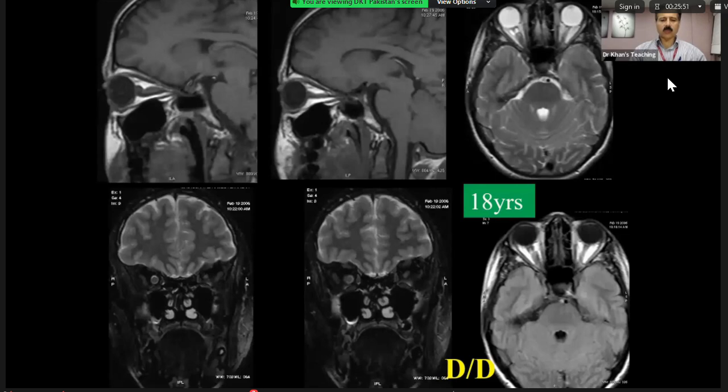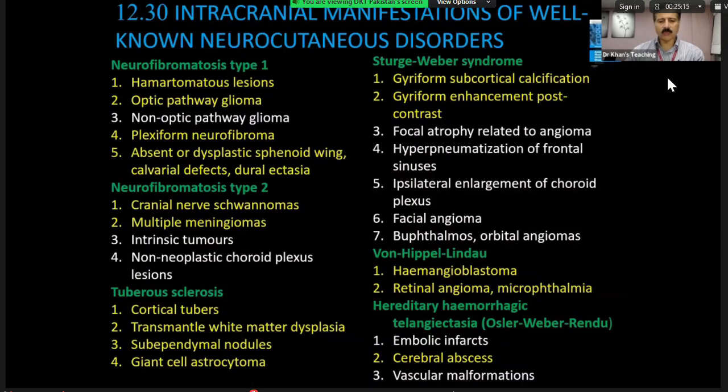So a grade 1 tumor might not enhance. That's a take-home point. At times they will not enhance. Another thing which can be asked in the exam is this appearance on a coronal sequence, where you can see this optic nerve and you compare it with this optic nerve, and of course it's not completely symmetrical, but this optic nerve is larger as compared to the left. It's a subtle finding. This is a difficult case, but I just put it for teaching purposes.